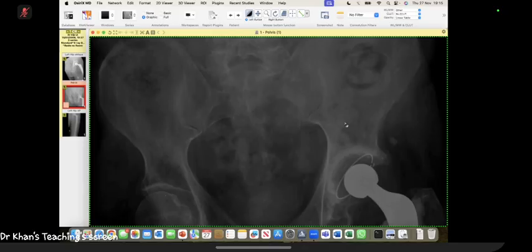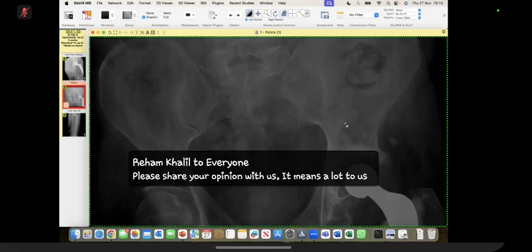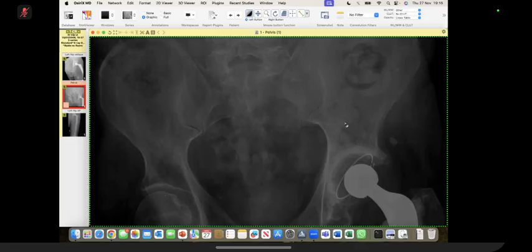What kind of orthogonal view do you want? Sir, lateral views of this lumbosacral spine, to see the presacral space involvement. How will a lateral view help you? There may be some extension of this mass in the presacral space displacing the rectum, so maybe I can find it. Okay, how will you like to confirm this?